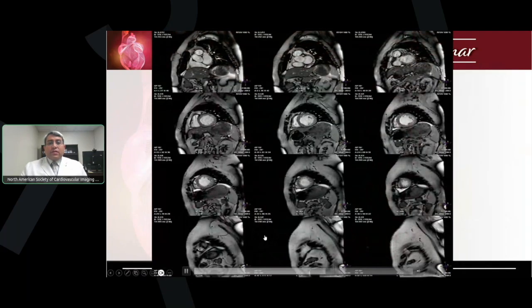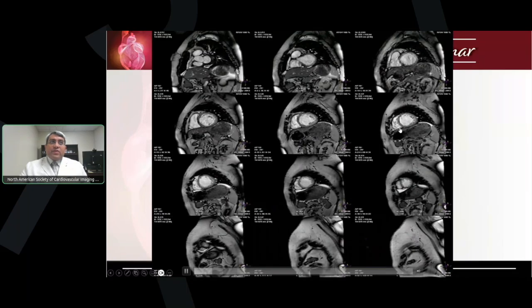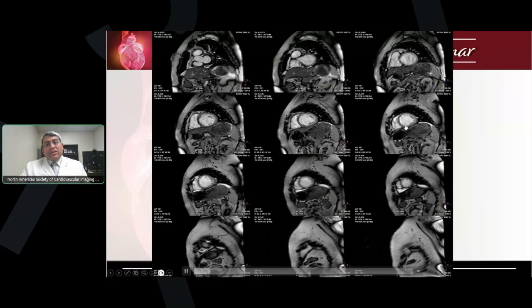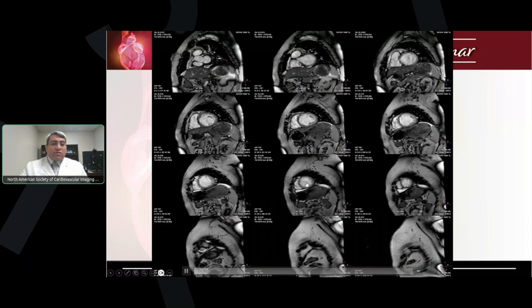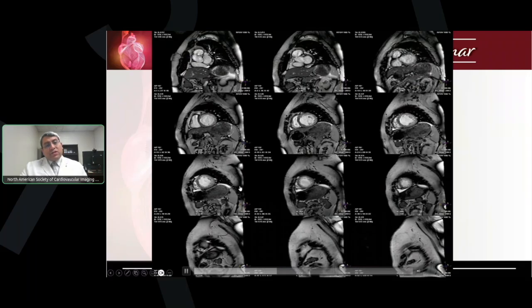You can see here an MRI picture for this patient taking the whole left ventricle, and exactly as you mentioned, with non-compaction, you may find, especially with middle age, as the patient grows older, the myocardial function starts to get weak, and the contractility starts to decrease over time. And you can see trabeculation here. It may not be too prominent here on the screen, but in the real images, when we measured it, it was more than 2.3 to 1.